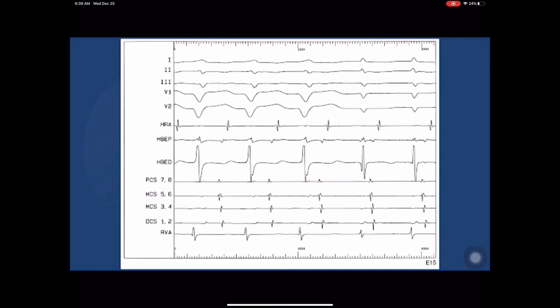Then look at your ventricle and you find out an aha moment, because while these 2 intervals are constant, this interval changes. And not only that, this interval here is different than this interval. So you have 2 ongoing tachycardias not speaking to each other at the same time. So even though it's a tricky slide, if you make the measurements, you will come to the conclusion that you have VT on the left, and it's occurring during the presence of an ongoing SVT.